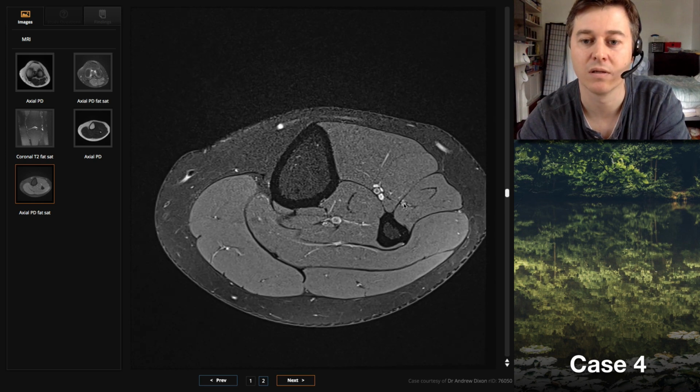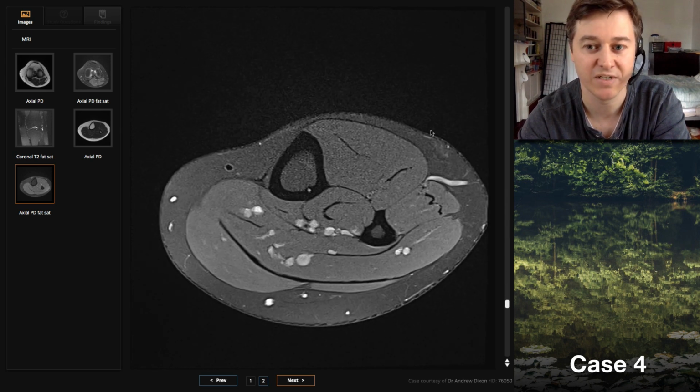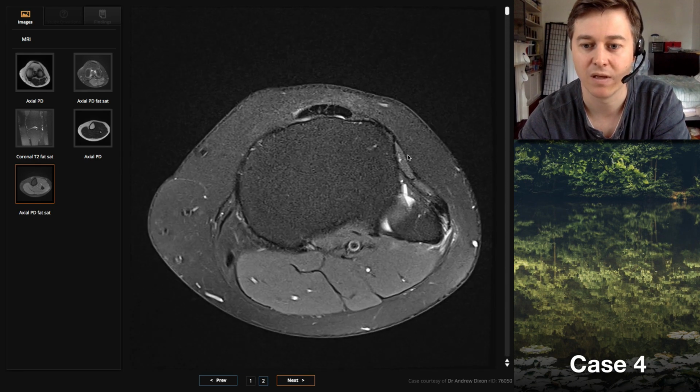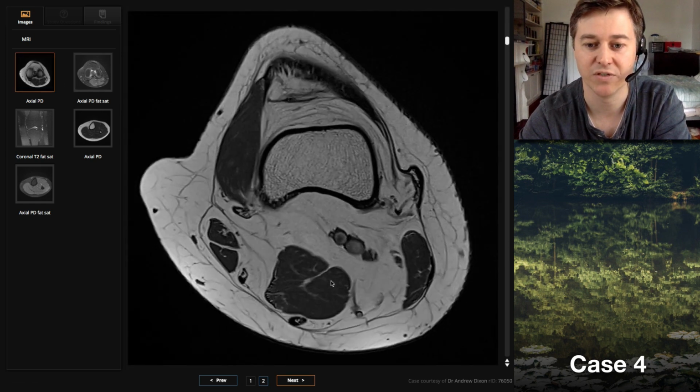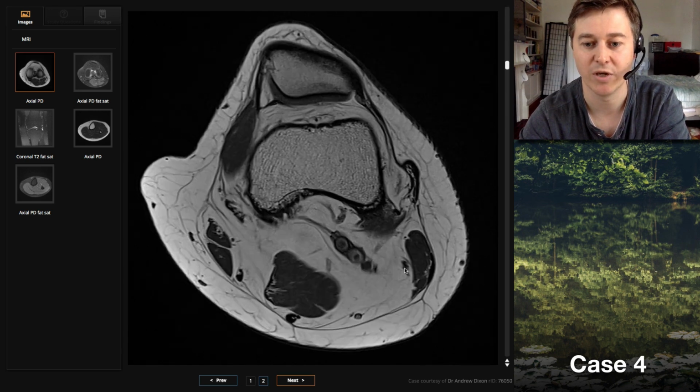Oh, look at the signal of the muscle. Yeah, exactly. So you'd be looking in this anterior compartment to see whether there's any signs of denervation edema. There isn't in this case, so they haven't actually developed any denervation edema. But I agree, your description is correct. So when we follow from the top here, we've already divided our sciatic nerve. So we've got our tibial nerve here, and here's our common peroneal nerve coming off.